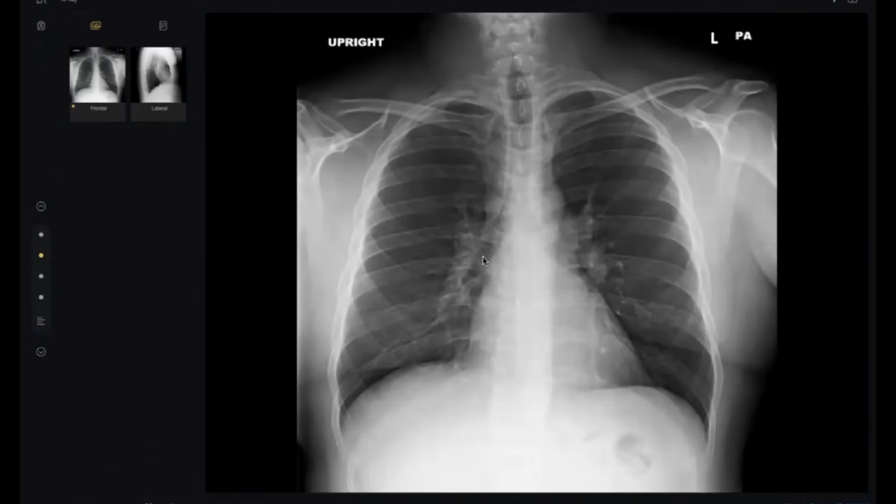Do you think TB will start with lymphadenopathy like this without any parenchymal affection? Generally, we are radiologists, not pathologists, so we go with the available radiological findings. Bilateral symmetrical lymphadenopathy like this suggests sarcoidosis more than TB.